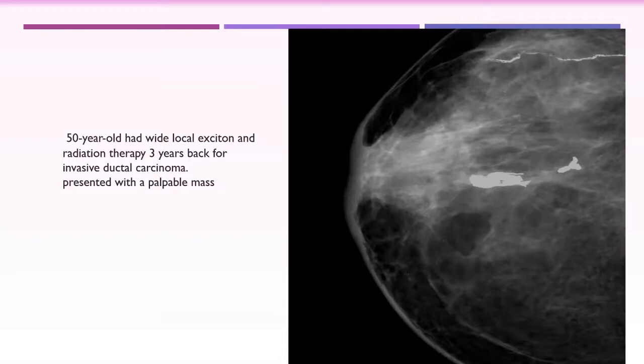The calcification marks the site of the surgery, so we will look in the area around this calcification for the recurrence. In addition, if there are any changes in the calcification, like what? The disruption. Excellent, well done. Now the calcifications are forming a large single opacity, or one unit.